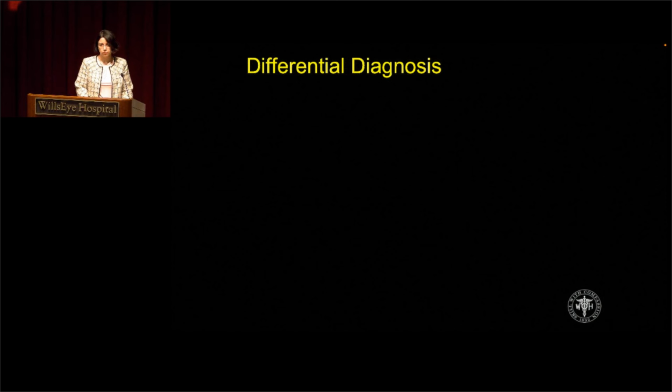Want to know a little more about the patient's family history, any retinal issues, any exudative retinopathy that's known in the family. Something like Norrie's disease could cause an exudative retinopathy like this. For that, I would look for any corneal abnormalities or opacities, microphthalmia or developmental delay. Incontinentia pigmenti could cause a phenotype like this, though this patient's a male and it's lethal in males unless they're an XXY. But skin changes would be characteristic for that diagnosis.